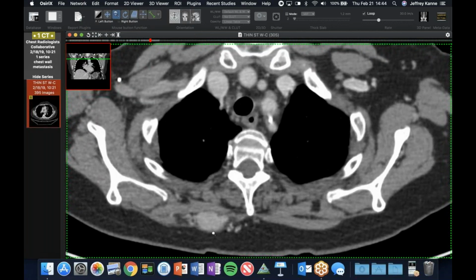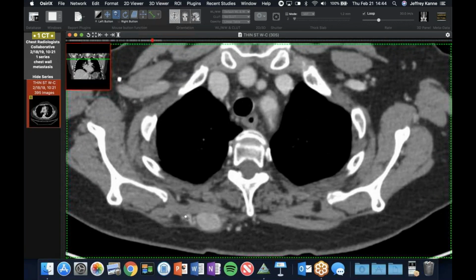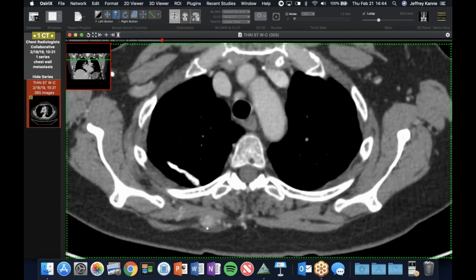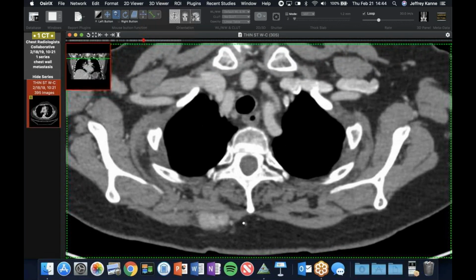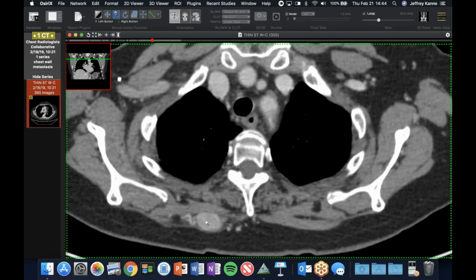The reason I'm showing this is, first of all, because we all know renal cells can be really sneaky. But I thought this was cool because you can see all the vessels that this thing has parasitized. So it's a very hypervascular tumor, and it's just right along the trapezius. All these little paraspinal vessels are coming in and out of the tumor. It turns out the patient actually had pain at the site at her clinic visit that day, so they're going to probably just locally ablate it because it's her only site of disease at this point.